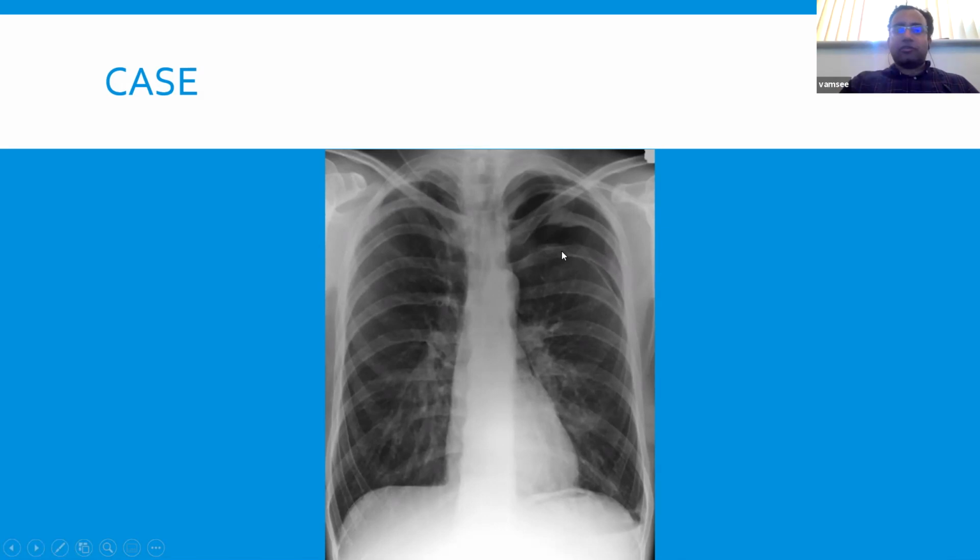I don't know if you're seeing it on a phone or on a big screen or something like that. But you've got lung markings going all the way to the margin of this rib here, the superior aspect there. And then it suddenly drops. This is all pitch black along there, and that's your simple pneumothorax. It's a simple pneumothorax because there is no tension.